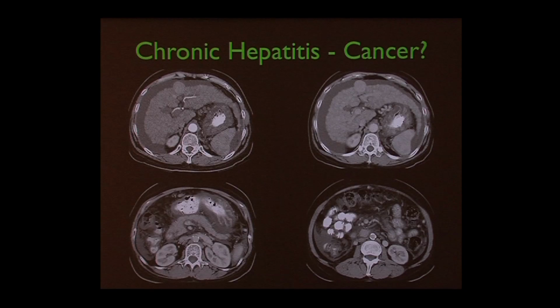This patient, this could look like cirrhosis from alcohol abuse, but this is cirrhosis from chronic hepatitis. And this liver, does it look like the other one I just showed you, the normal? Number one, it's not dark, like the fatty liver. That was a fatty liver because it had more fat, therefore it absorbed less X-ray and was dark. This one is a little dark, but it's very nodular. You can see all this little nodularity, and along the margins, it's very lobular because of nodules. It's also small. It's shrunk down. It has fluid around it.